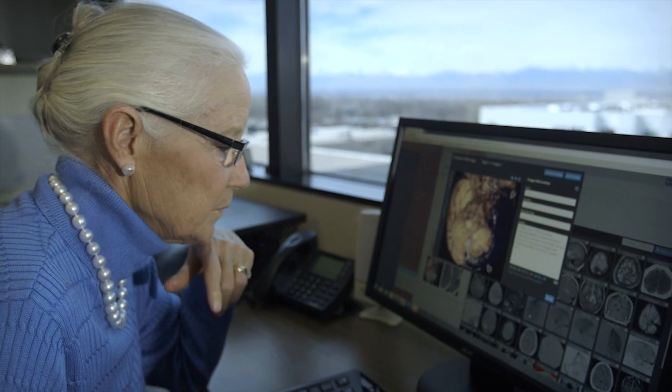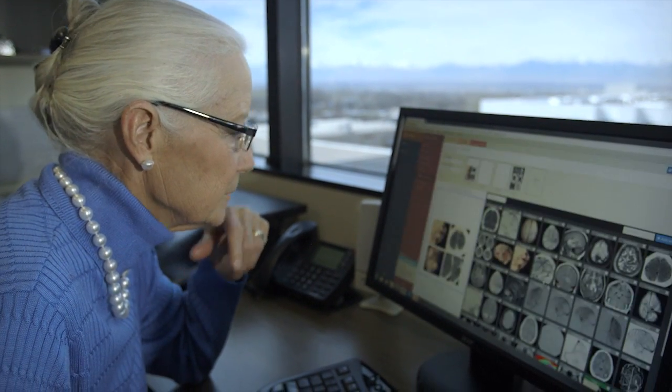Hello, I'm Ann Osborn. I'm going to show you a case of an 8-year-old male who was brought to the emergency room by his parents because he'd been complaining of headache and then was starting to throw up. A quick examination showed signs of increased intracranial pressure, and so an emergency CT scan was ordered.